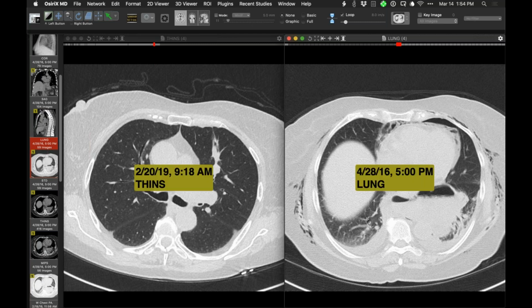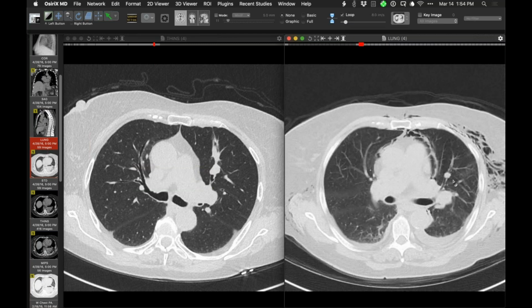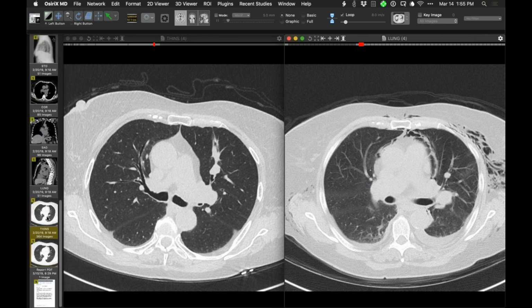So this is some years ago now, and looking for that lesion, whoop, there it is. So one can find it if you know where to look, and it's smaller at the time. So it's grown over time, but slowly. So of course, slow growth, endobronchial lesion over time ought to be what this turned out to be, which is a carcinoid.